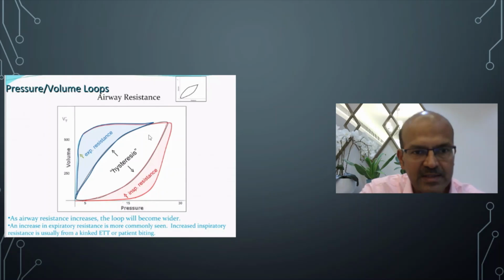So you can see here that the volume stays the same from this point of pressure till this point of pressure, and this is the principle of weaning the pressure once you achieve the lung volume in high frequency.